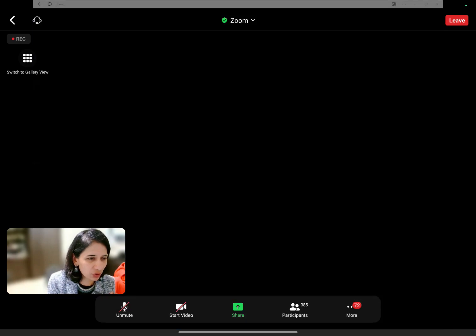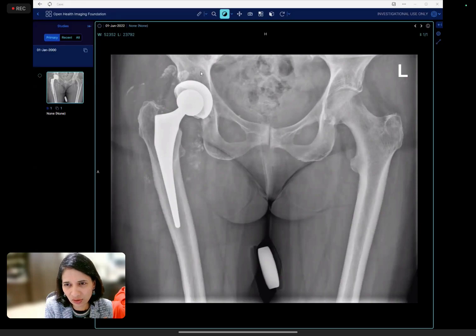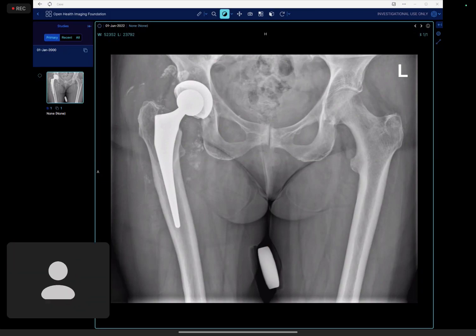Because it's a pseudotumor or the reaction. So this is the thing, and you said there are also these findings here. Now you can relate to that, isn't it? Because all this is lucent because of what we saw on the MR. MR, actually, let me load it together.